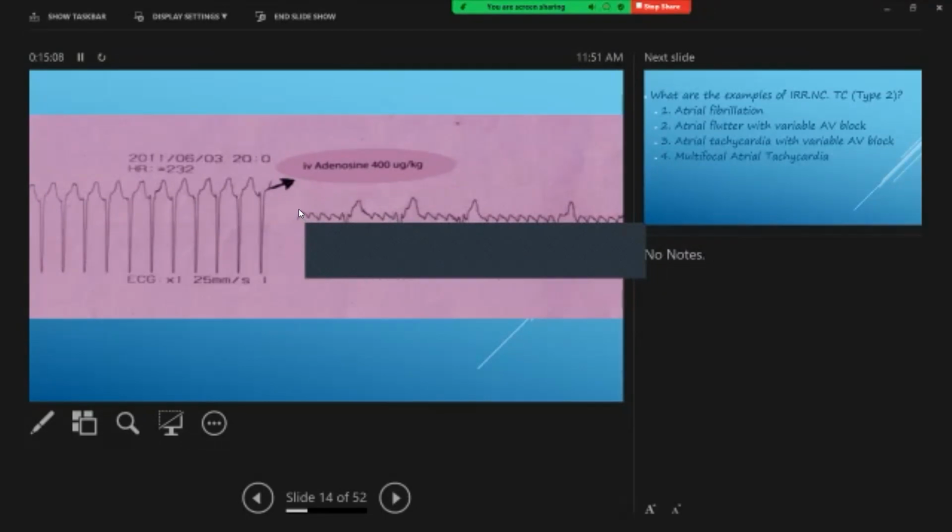So in this patient, what we could see is this sawtooth appearance. So this is atrial flutter with 1-to-1 AV conduction. Why should we diagnose this condition properly? If this is a female patient with CHADS score more than 3, or a male patient with CHADS score more than 2, those patients need long-term anticoagulation if it is atrial flutter.